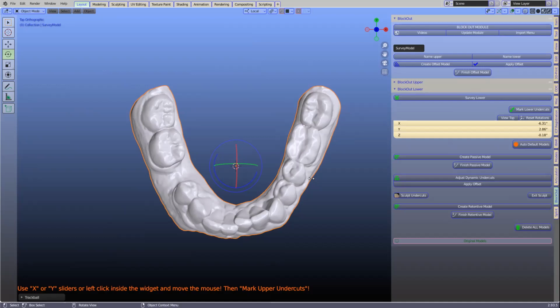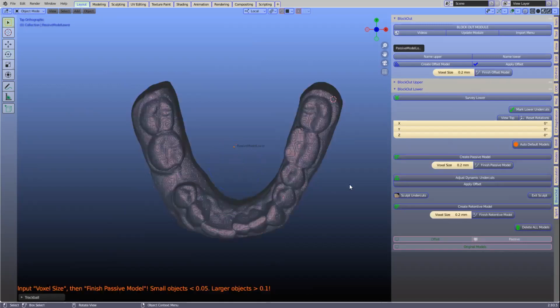You're going to be waiting. Like paint on layer, it's going to take a long time. Boolean cuts will take a long time, because essentially 0.1 means that the vertices are spaced 100 microns apart. So if you just go 0.2, you've halved that basically. For a splint, it's fine. In the crown module, it's remeshing at 0.05 or 0.03 for a die. But a die is small, so it doesn't take that long.